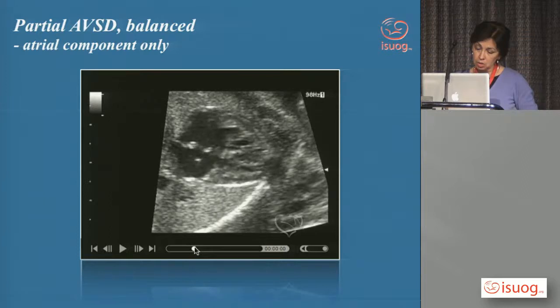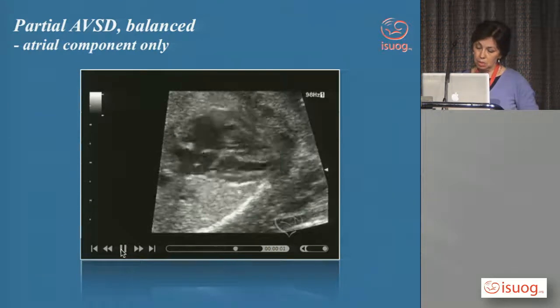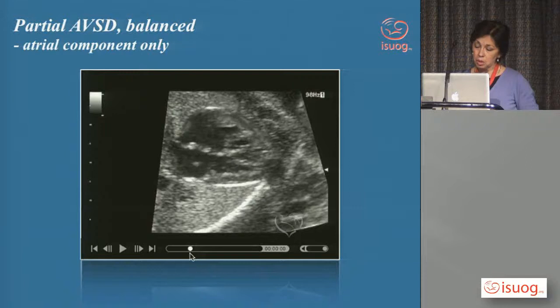So you can see that you can stop that picture sometimes, and you could print that image to say that there is a normal offsetting here, even if it's short, although the right ventricle is slightly bigger than the left ventricle in this particular case. And the ratio would be wrong, yeah. So I think in cases like this, the ratio probably would be very helpful.